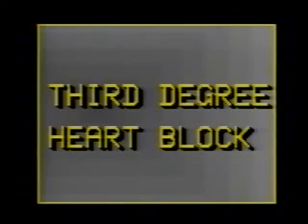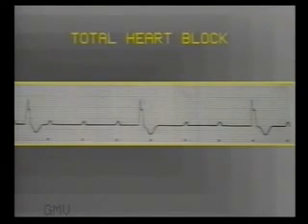Now we come to third degree heart block. Observe this ECG. You can see P waves at regular intervals at a rate of 100 per minute, and there are QRS complexes also at regular intervals at a rate of 30 per minute.